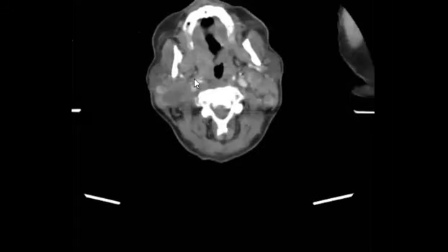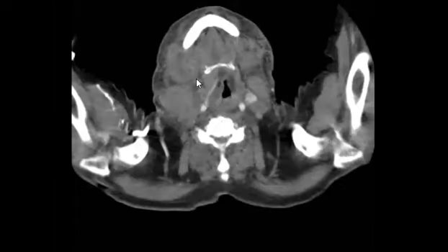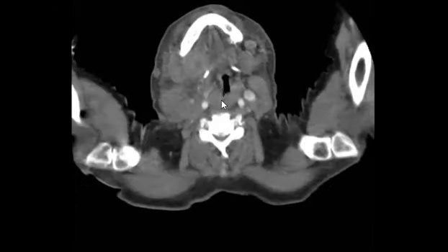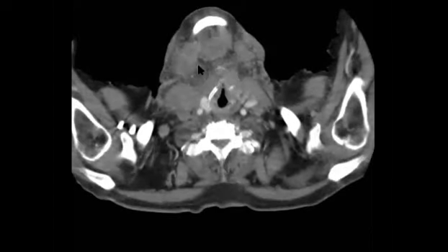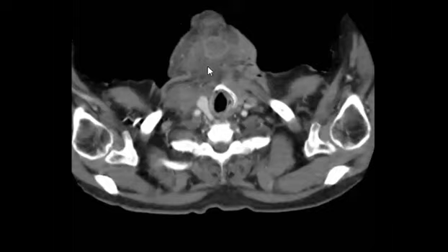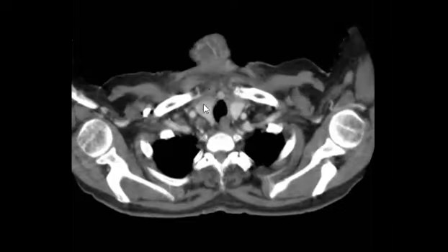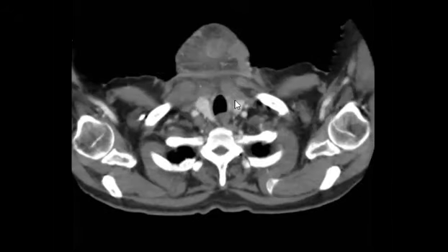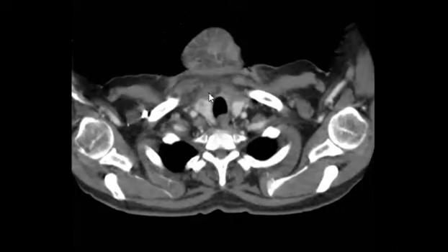This soft tissue can be masses confluent with this one, or it could be lymphadenopathy as well. And the nodule that you mentioned, Ala, maybe is encroachment from the lesion, or maybe, as you mentioned, something like a nodule as well.